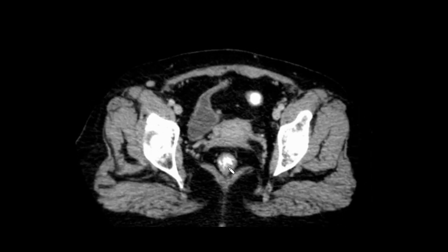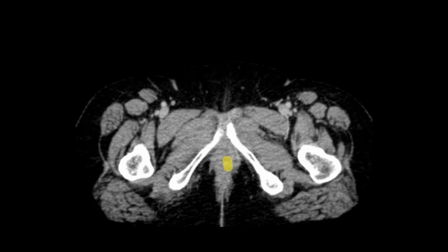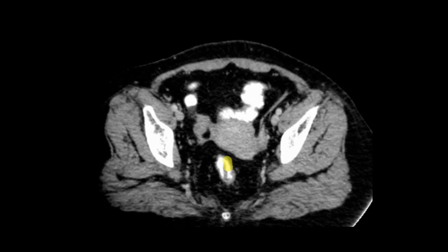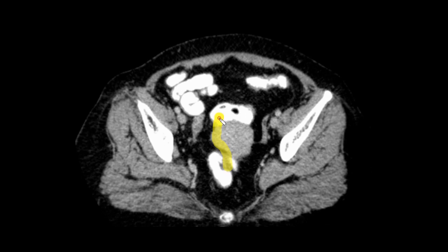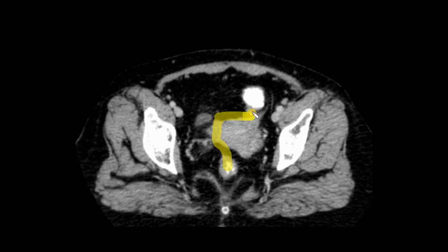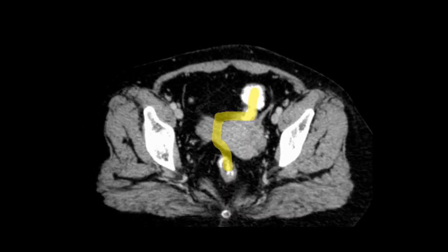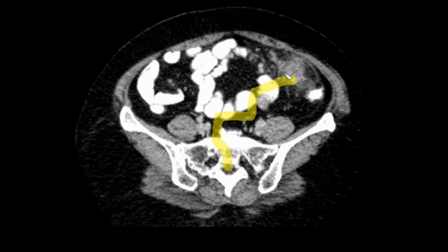So by now you know this is the rectum, right? Anal canal, rectum, forming the sigmoid and the descending.